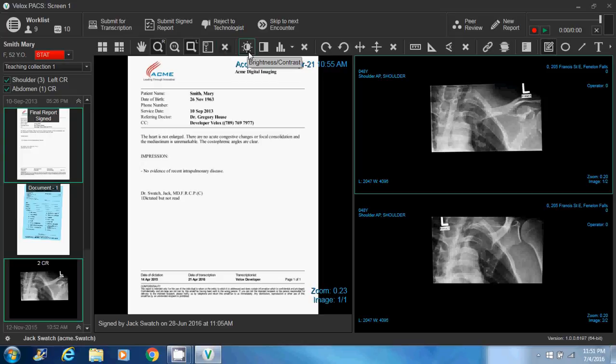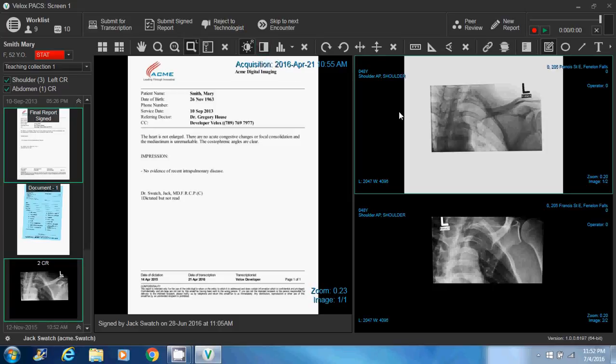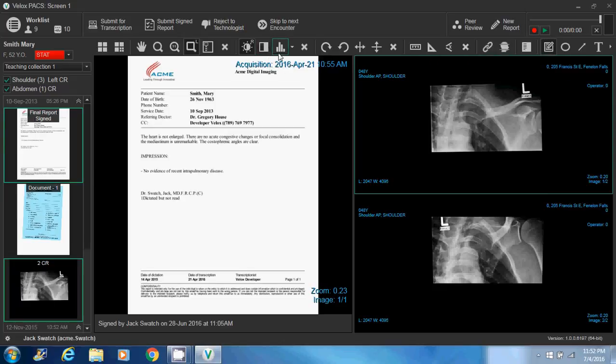Moving forward with the next set of our tools, you'll notice the brightness and contrast tool. Simply click on it. Notice that there's the letter R indicating that it's the right mouse. Select your image and you can move your mouse to contrast and brighten your image. The next item on the toolbar is the inversion. Simply select it and you can invert the image. This is the change window level, and it makes more sense when looking at X-ray images. Again, to the right, you'll notice the reset button, which will clear all the changes you've made.